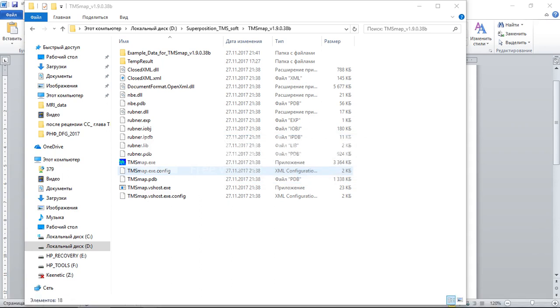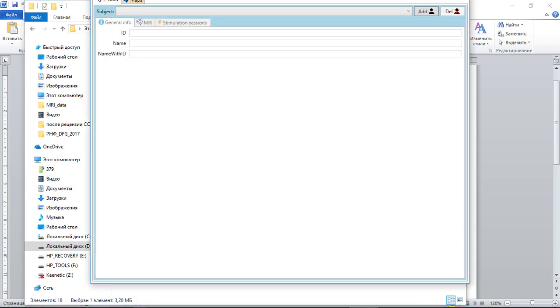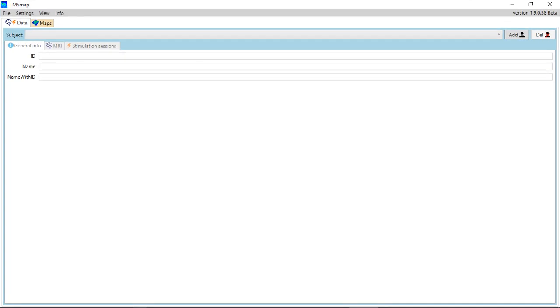Okay, here we go. We now present the short version of the TMSmap video manual. So we have to open the program TMSmap.exe. Yes, I want to start it and I want the full screen version.